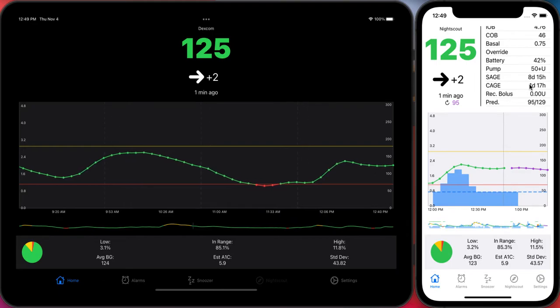Sensor age is going to be 10 days for Dexcom, and cannula age is going to be 3 days. And you want to use in Nightscout CGM sensor start to trigger when you start the session in the Dexcom app, and pump site change. And those are specifically the two that you want to use every time you do those, and that will reset these.